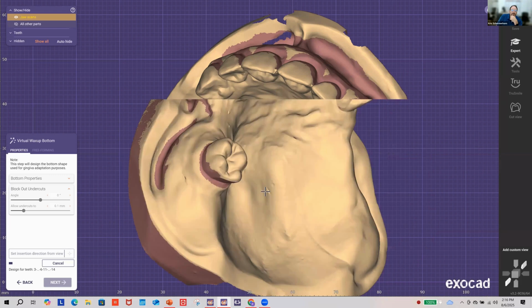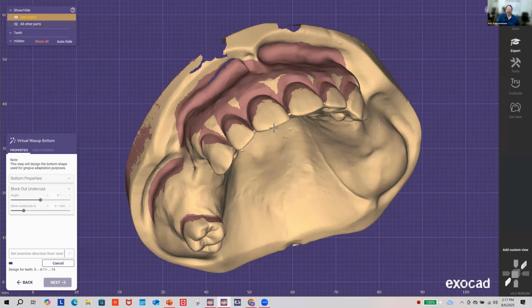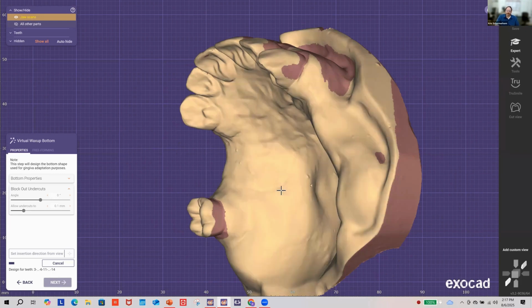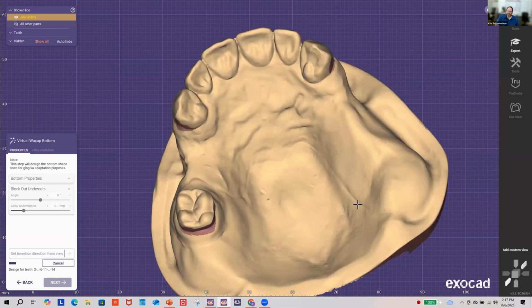That wouldn't be a problem, changing that. And so what the software is doing now is taking all those parameters, softening the block out, and creating that refractory model. Now you might see on this model this indent, like a bead line. If you do a bead line, I would recommend that you do a bead line very faint. Don't go very deep. There's definitely times where I won't do a bead line at all.